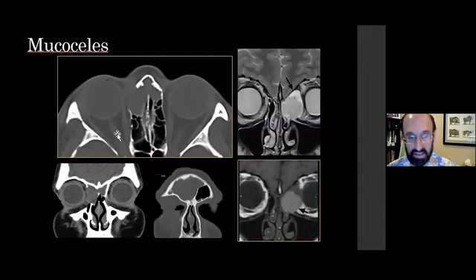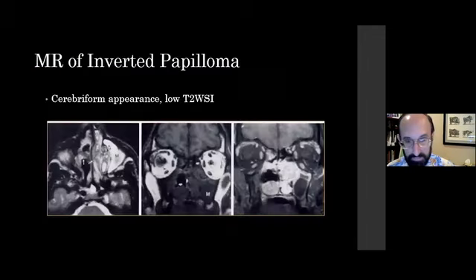And in this case, here's the mucocele on CT. Here's a different one on MRI, where you can see that the secretions are bright on T1 and intermediate on T2. These were inspissated secretions. How do we know that this is not a melanoma? Well, again, you get the post-GAD and you'll see the peripheral enhancement, but it may be that you need to get the CT scan to demonstrate that as well, because that's in the differential diagnosis.